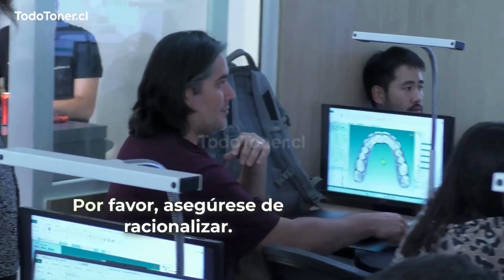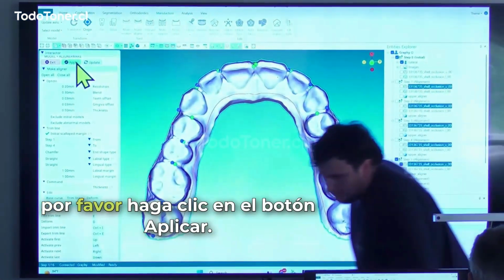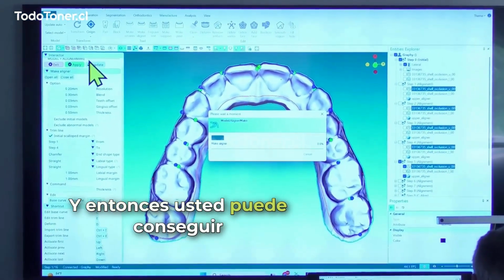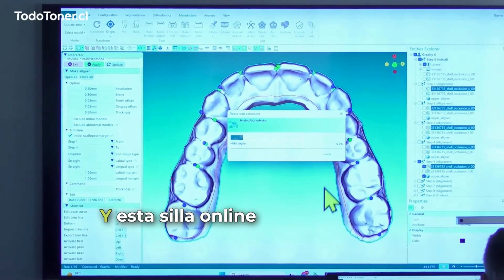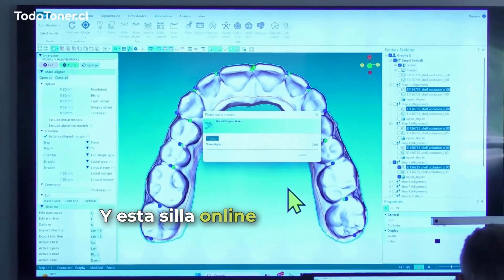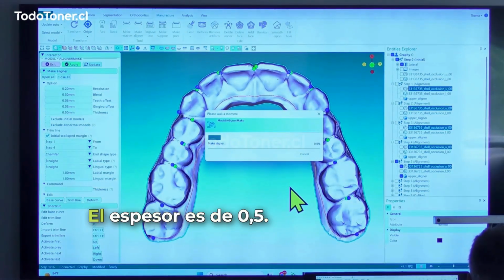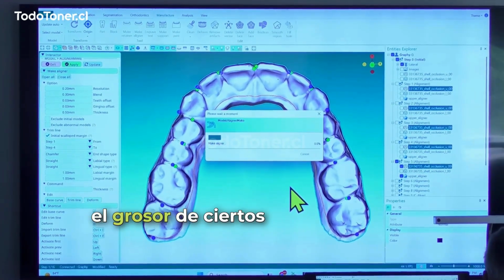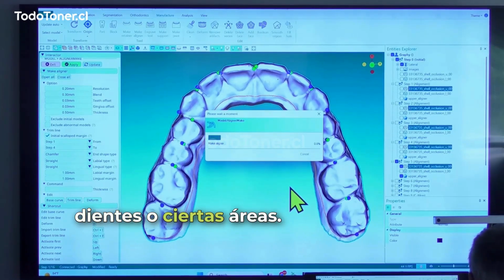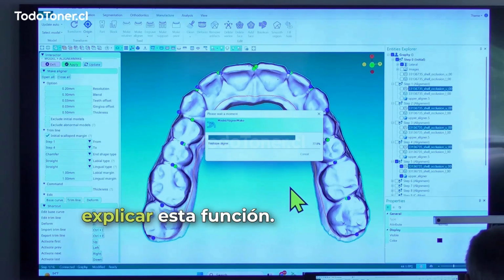So write this, please make sure of the trim line, and then if you are satisfied with this result, please click the apply button, and then you can get a line shell. And this aligner shell is the same thickness. This aligner thickness is 0.5. But sometimes you want to increase the thickness of a certain tooth or certain area. We have a different function. After creating a line shell, I will explain this function.